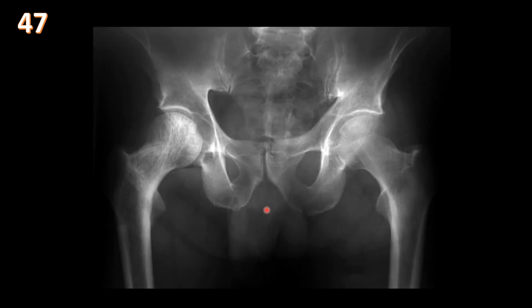So case 47, we have an AP view of the pelvis, and we see that there is thickened trabecula on the right proximal femur as compared to the left side. This is a case of Paget's disease. Paget's has three stages, but what you are most commonly going to see is that thickened trabecula either in the pelvic bones or in the vertebra.